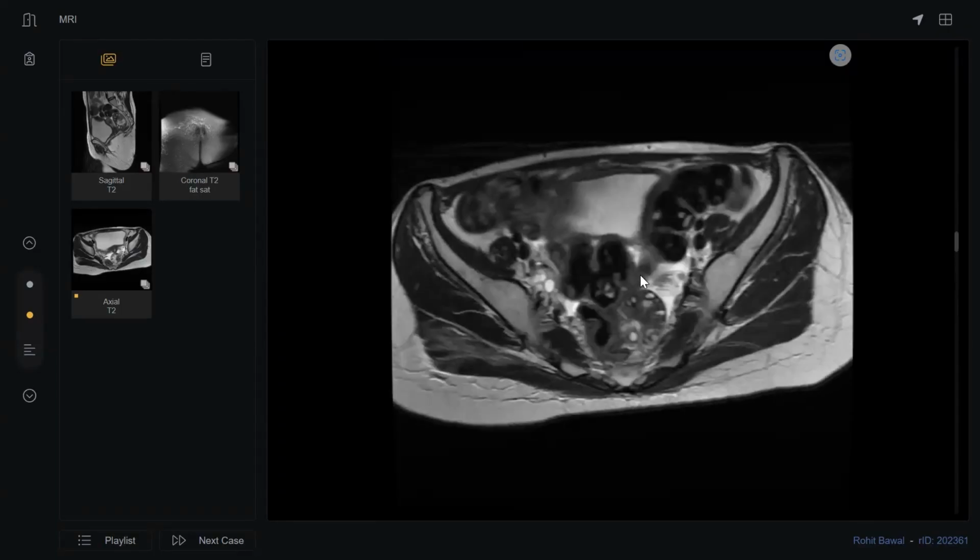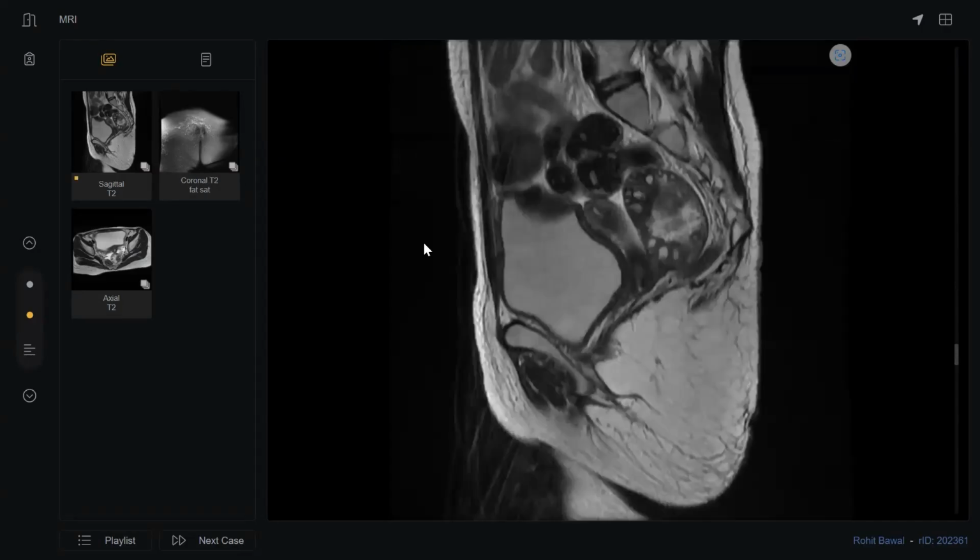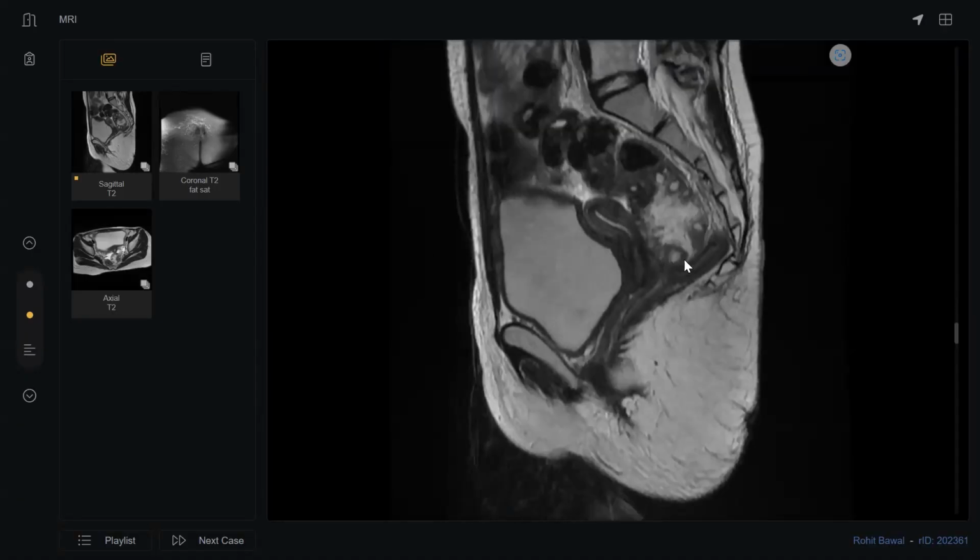So one of the most important signs of ovarian torsion is the ectopic location. Number 2, very huge; it looks like the same size as the uterus. Number 3, the edema. Number 4, the ascites.